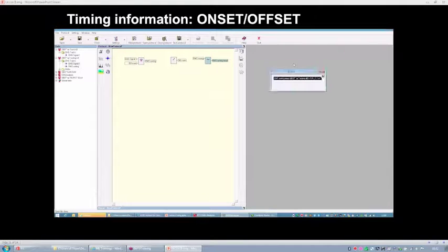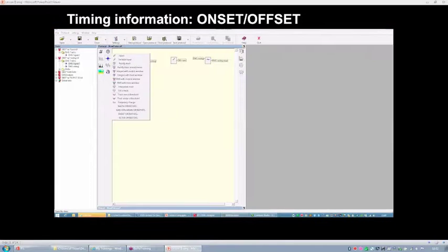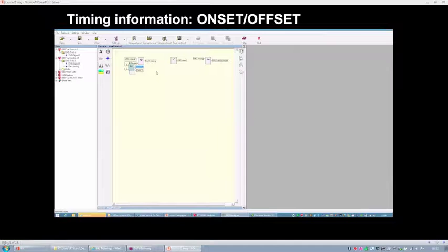Okay, so this is the mean value and the standard deviation. Now I will use a multiplication factor of 3. So 3 is a scalar input that I have to define, and I will multiply the standard deviation value by 3. So I will consider a value of 3 times the standard deviation.